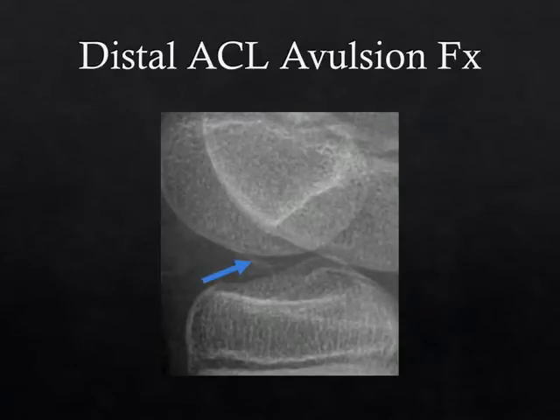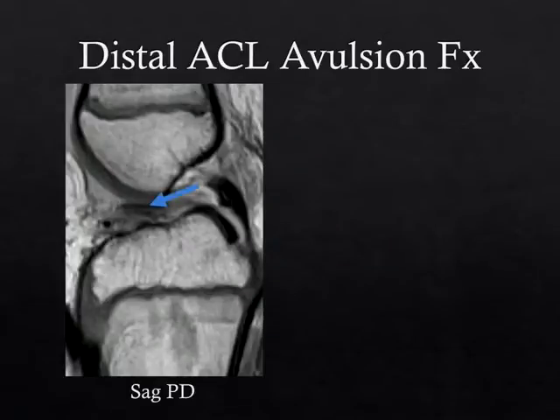This was another type 3 fracture in a 9-year-old boy, so the fragment is completely displaced away from the tibial epiphysis, and they were having trouble reducing it, so he got an MRI, and you can see the displaced fragment there. It's fairly subtle. It's just a thin cortical bone, essentially. And in between the fragment and the remaining tibia, there's often intermediate signal. It's usually hemorrhage or fibrosis or a mixture of the two. Here you can see that the intermeniscal ligament is anterior to the fragment.